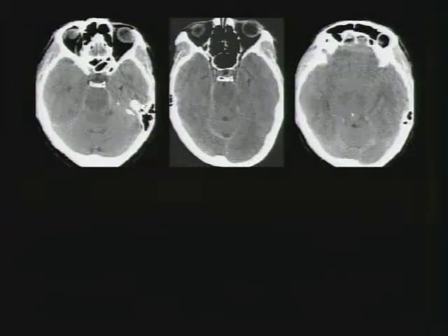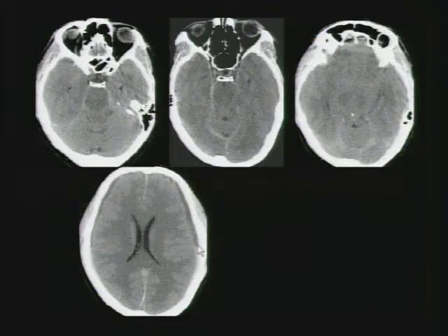So here is a case of a woman who presents with severe headaches, and it looks like she's got this kind of density down here. Does she have subarachnoid or even subdural blood? You can see everything looks a little bit tight in this case. If you come up a little higher, you can see there are bilateral subdural collections. You can see a fluid level within the subdural collections.